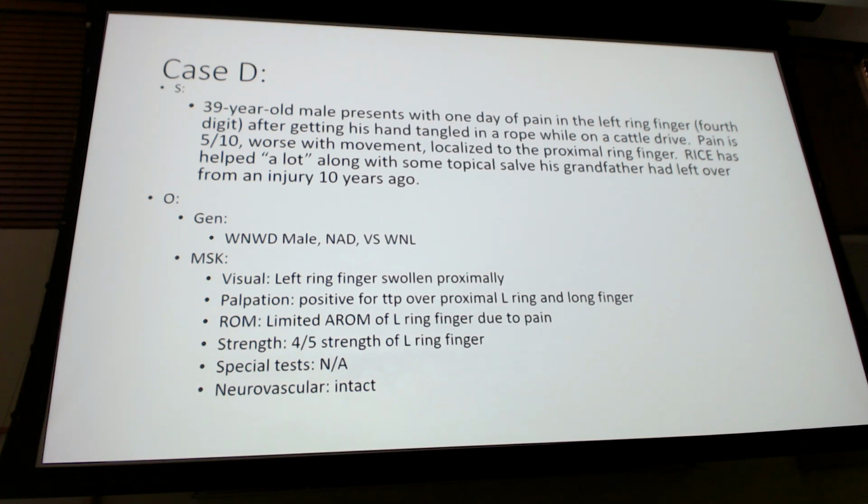Kind of like the hip, if you order just a right hip, they give you a full pelvis at first. If you order just a left finger, you'll get a whole hand and then the oblique and the lateral of just that finger. Just order a hand x-ray. Don't order just the finger. That way you can see everything.